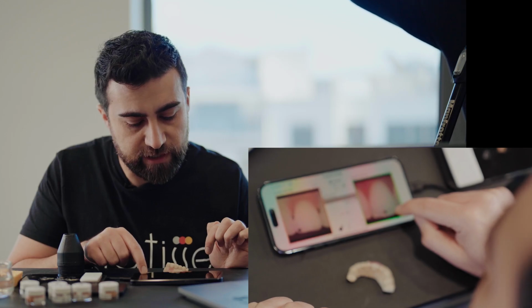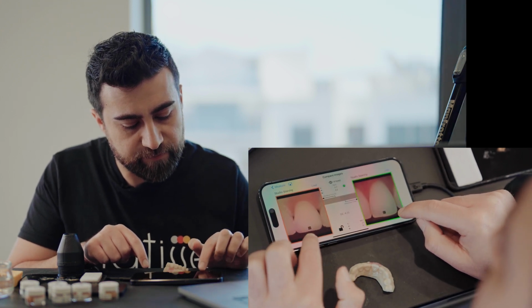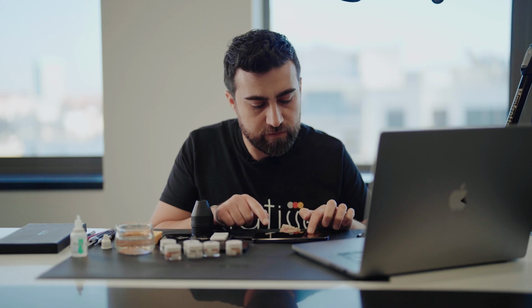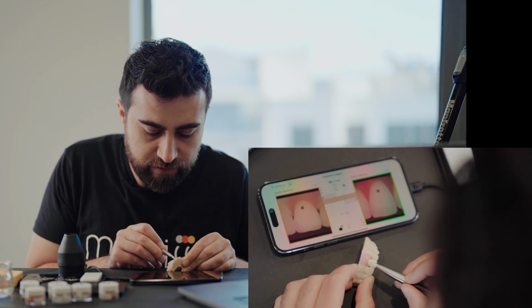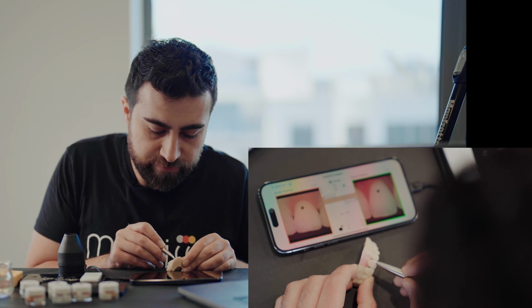The translucency is very nice. So you can see we are incisally Delta 1, 1.4, 2.8. So you can see how efficient and easy it is. And let me add a little bit more chroma. So I will just use the same recipe and apply it a little bit thicker to have a perfect match.